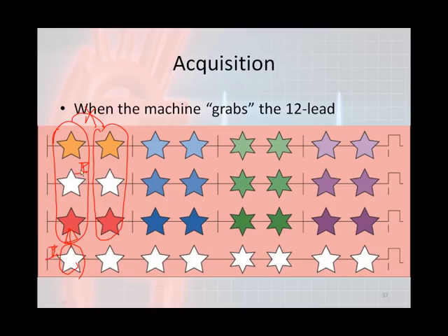Every single complex above that one correlates, all of these correlate with each other, so do these as well, and these as well. All of those correlate above, but you have no correlation between those right there. None of these actually correlate at all. This is the temporal relationship.